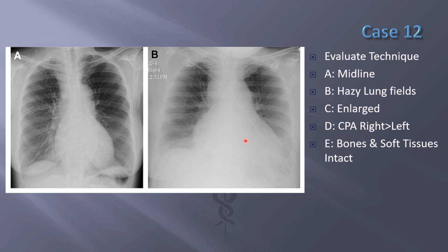So we had an acute change here from one to the other, and it got this enlarged heart. So this is something I'd be really worried about, pericardial effusion, something that happens really fast. If this was heart failure or cardiomegaly, this is something that takes a very long time. But this was an acute change over just a couple of days, and so this is the benefit of looking at prior studies. And she wound up with a pericardial effusion, and they had to put a catheter in and do a pericardiocentesis.